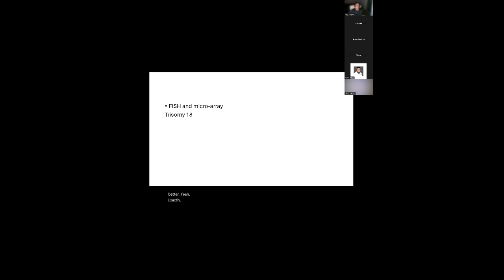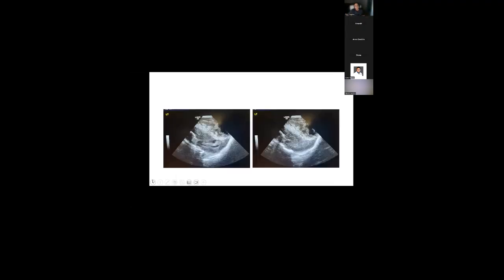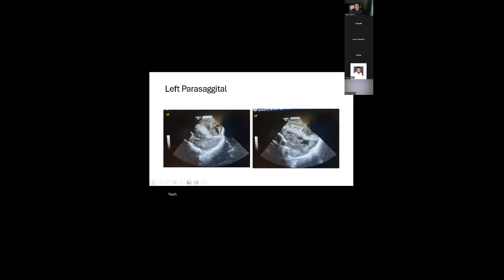For me, that's an intraparenchymal bleed. The question is, is that secondary to IVH? It's compressive, it's purely parenchymal, so I'd say no, because your ventricles are clear. This is purely parenchymal. And when you have a purely parenchymal bleed, there is the possibility of an early coagulopathy, low platelets. The other thing is a vascular malformation. So the only other thing that I'd do is put Dopplers there, because you can bleed into the cerebrum with a vascular malformation.